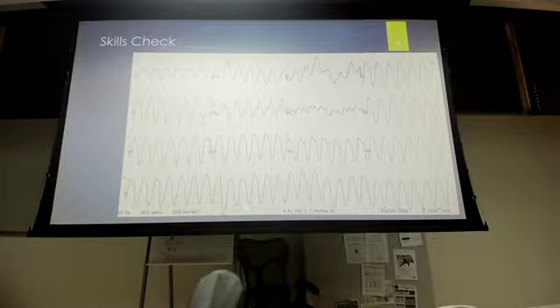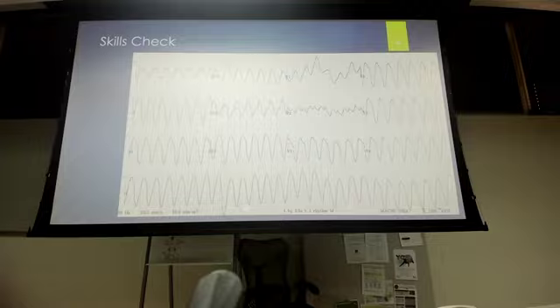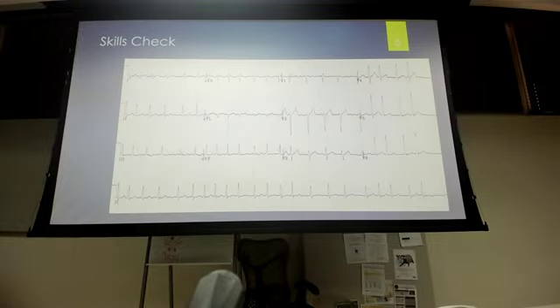And in real life, I say maybe, because if you're sitting there talking to them before they pass out, okay. But in general, once they go into V flutter or V fib as well, what's the difference between V flutter and V fib? Irregularity. V fib is going to be irregular, just chaos going on, right? This is VTach.